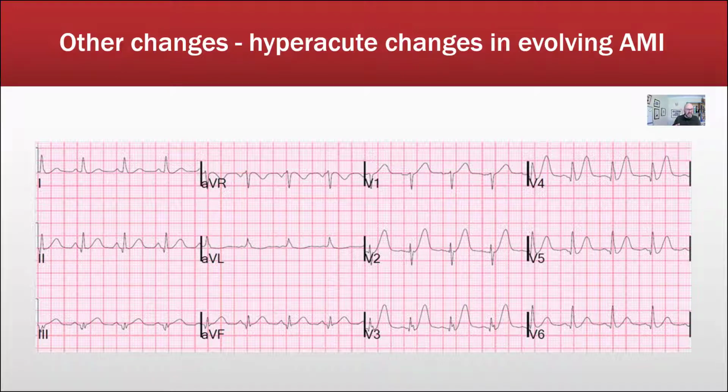Myocardial infarctions are not an instantaneous event. The process is one of evolution, and it's going to be over the first few minutes, then the first few hours, days, weeks, and eventually months. And each of these timeframes has specific ECG changes associated with it.